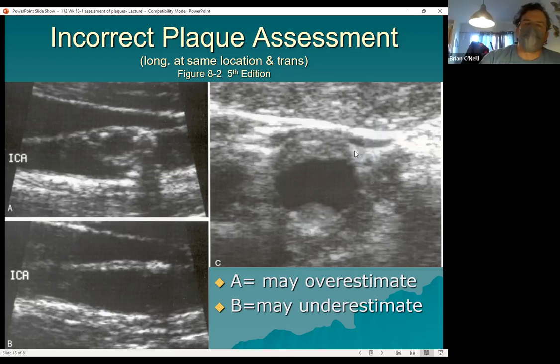Like when Kirsten did the area measurement, that story I was telling where she wanted to compare the area of patency to the area of the vessel that had the stenosis, obviously you need to get that in transverse. And sometimes it really doesn't matter if it's heterogeneous or homogeneous.